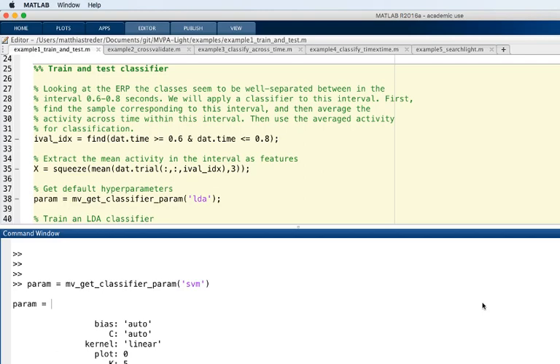In many cases, you don't really use this slope or these probabilities. What you can do, and you can also do in the toolbox, is the classifier can output probabilities. That would be actually the values along this slope. So you can get a probability for each sample if you want that, and that's what people sometimes want. But in many cases, you wouldn't be interested in that.